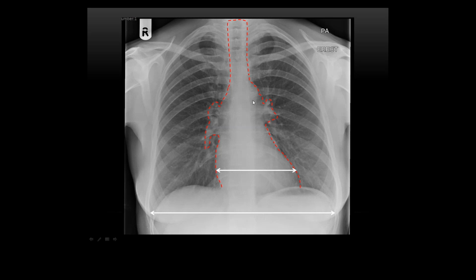Now, it is sometimes quite tricky with chest X-rays, particularly with people who have pulmonary hypertension and cardiac failure, because you can get quite dense vessels around there as well, so they can be a bit tricky sometimes. But if you've got any queries, then just pop down to the radio department and ask, because the hilar is one of the trickiest areas, I think, on a chest X-ray.